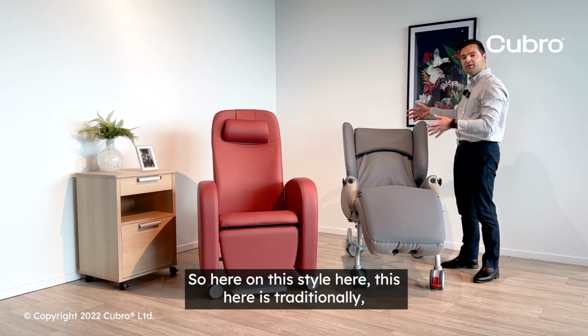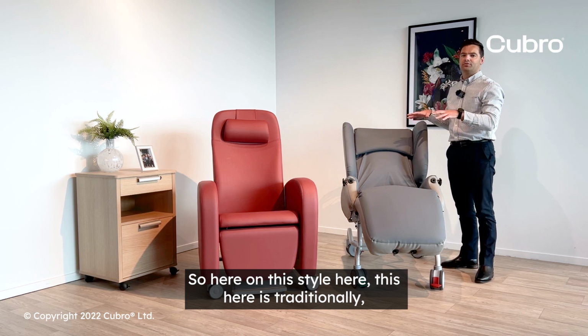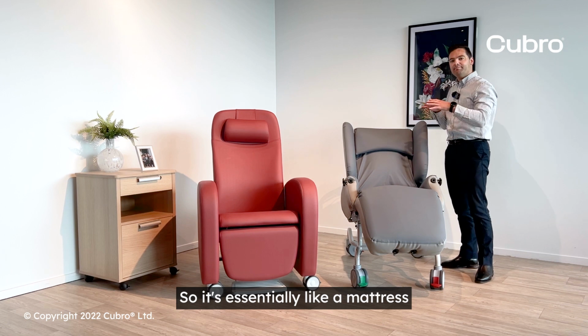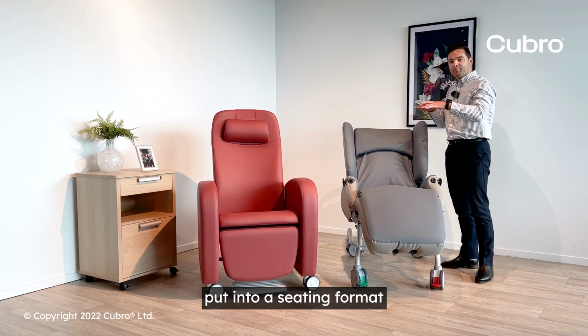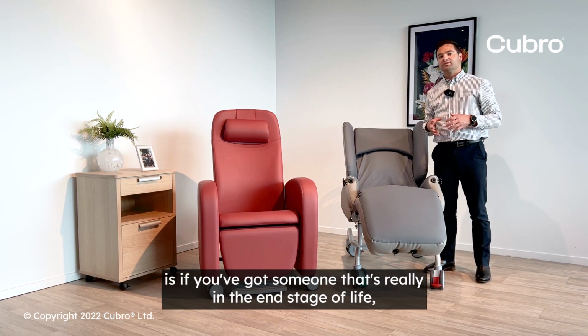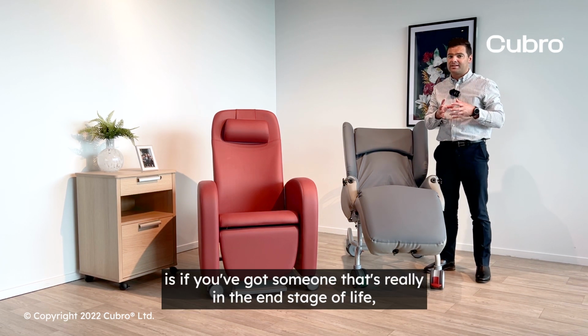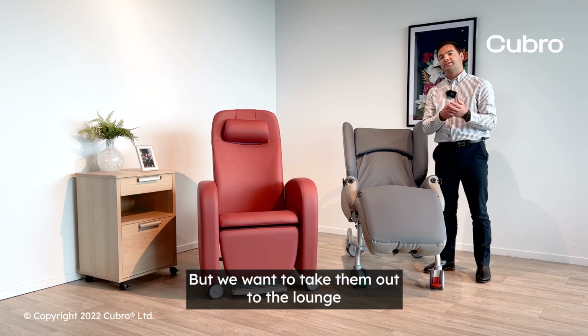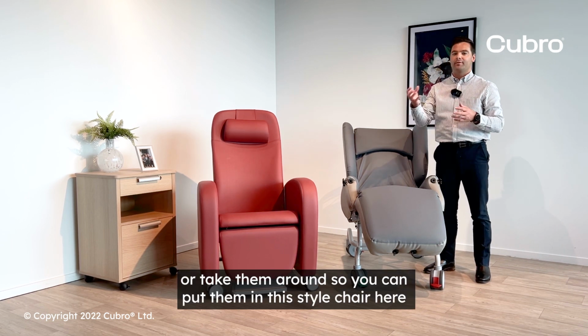So here on this style chair, this is traditionally a full care chair. It's essentially like a mattress put into a seating format. A traditional case where this would be used is if you've got someone that's really in the end stage of life, end of life care, and they'll traditionally be bed bound, but we want to take them out to the lounge or take them around.